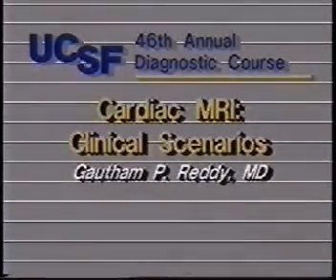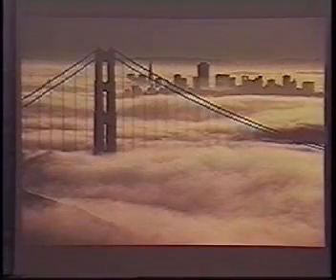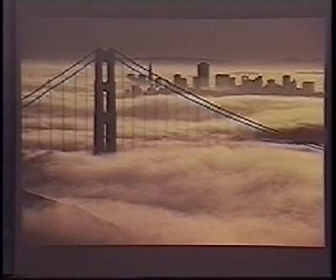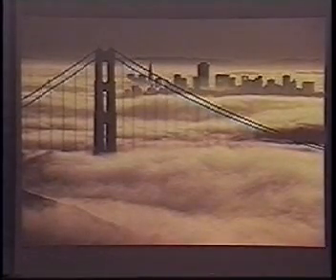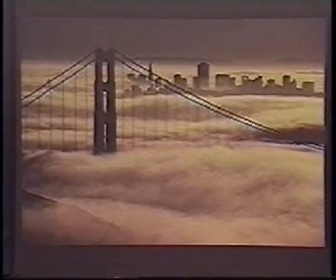How many of you routinely do many cardiac MR studies? And how many do any? Okay, so just a very small number. And what I'm going to go through right now is the number of cases in cardiac MR. First I'll show you the case and then we'll discuss.